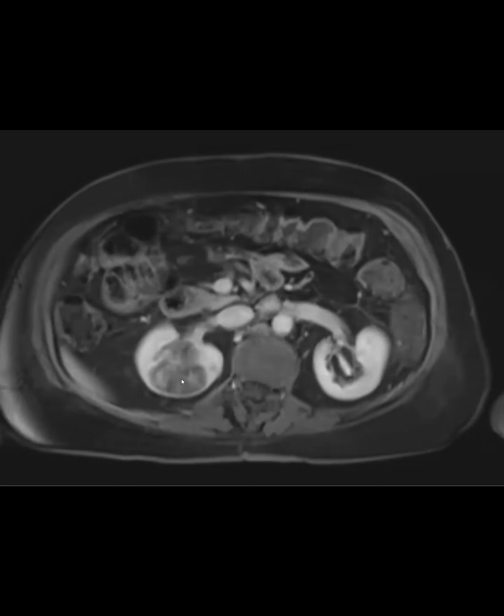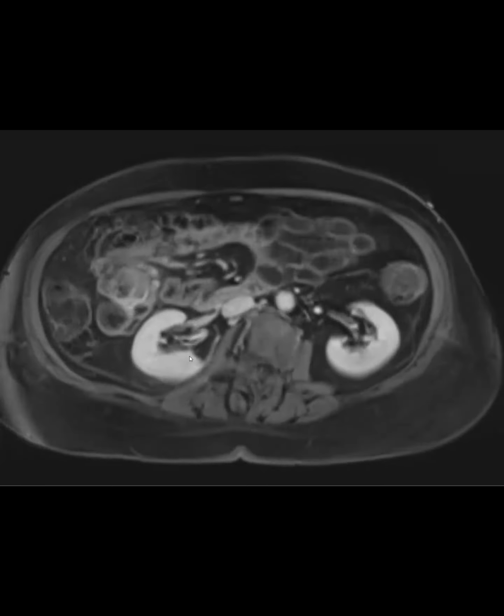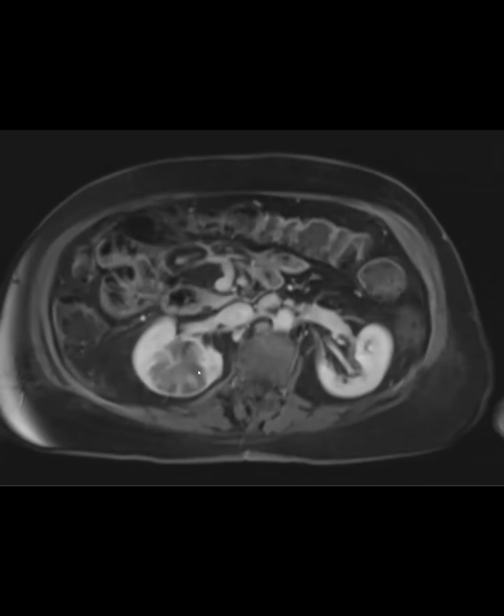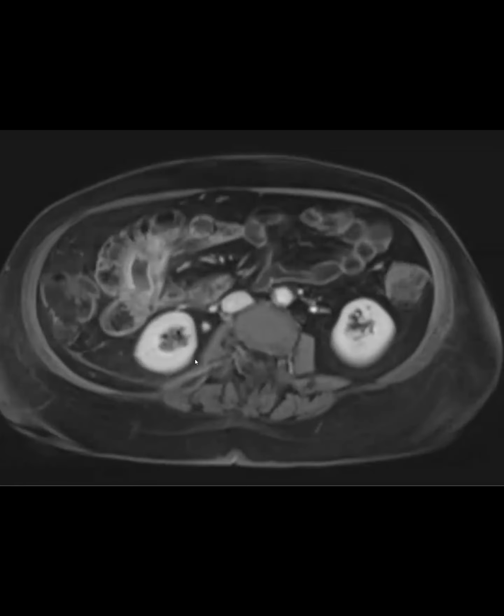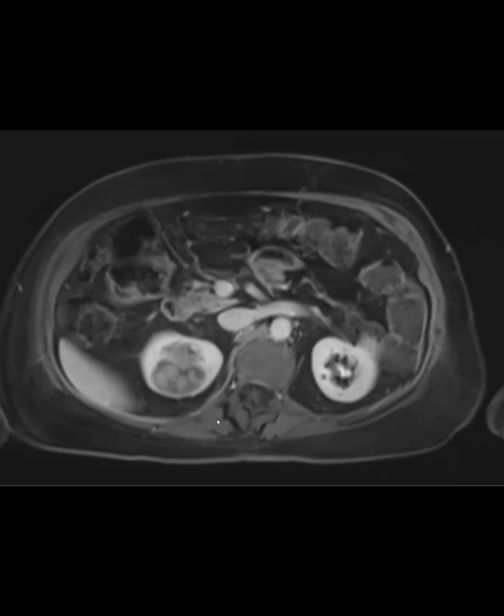I don't know why that is. Maybe the tumor cells have been shedding down the urothelium and down the ureter the whole time. But be very careful on the surveillance scans to look for the distal ureter that might be a remnant, as well as the bladder. So this was just a urothelial cancer.